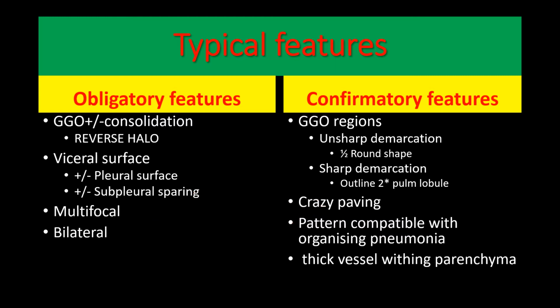Now for that, first, what is CORADS 0? CORADS 0 means that the imaging is not adequate. So if the patient has not taken a deep breath or the patient has done some sort of movement, which has distorted the CT image, and then we cannot report that image, that's when we say that this is inadequate, repeat the study. Okay, CORADS 0 tells that I am not going to report this because this is not a good study to be reported. So CORADS 0 is excluded, it doesn't mean anything, it just tells that I can't report this.